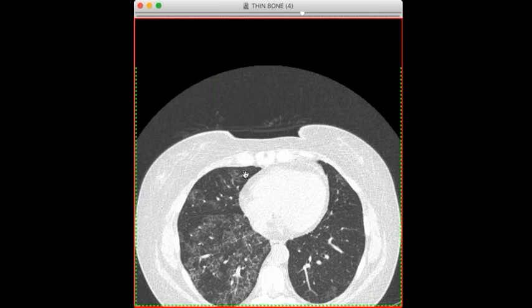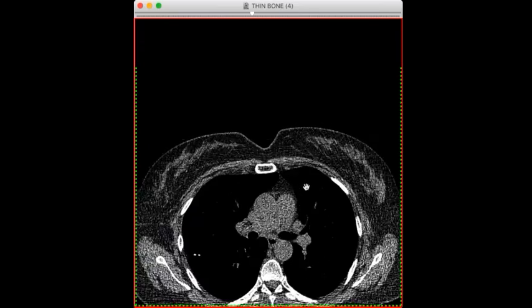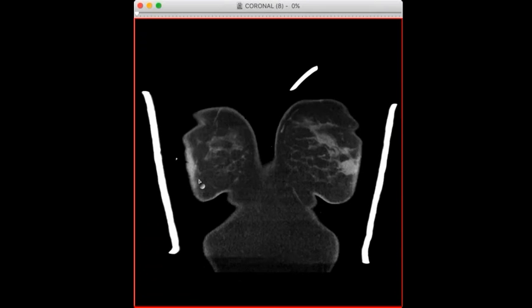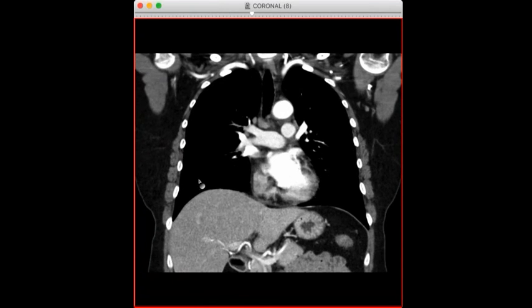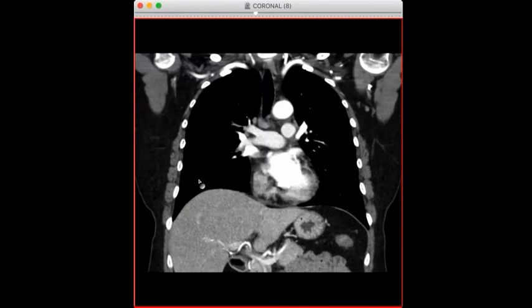Jeff, was there high density material in her nodes at all? Does she have some metal in her nodes? You know, I was wondering the same thing, and the answer is not really, no. Here's the soft tissue from the outside one. And you can see she has just normal looking nodes. I didn't think they were particularly dense.